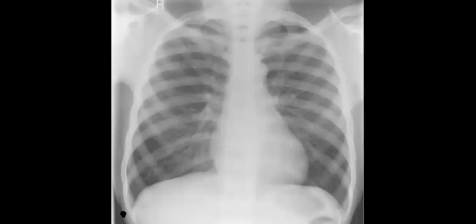So try to activate your checklist, and when you reach something like you don't know where exactly, you try to talk until you reach the abnormality. So frontal radiograph, maybe adult male patient. So you will try to reach anything positive. Maybe the lungs, you can see that they are clear, and the cardiac and mediastinal contour is okay.